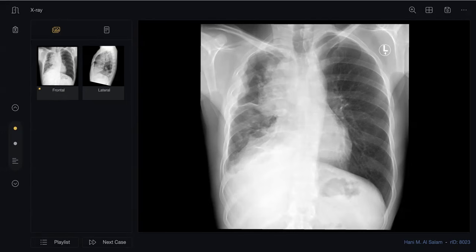So my impression here is that of a pleural-based mass or a right mediastinal mass, pleural-based mass. So encasing the lungs, I'm thinking most likely pleural mesothelioma. It may also be an anterior mediastinal mass, which is with that pleural infiltration, such as invasive thymoma.